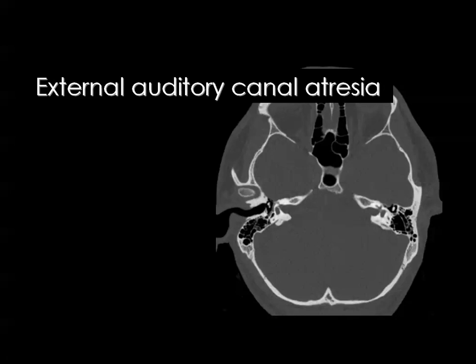It's important to assess the integrity of the middle ear as well as the inner ear structures in cases of external canal atresia, whether the soft tissue atresia or the bony atresia. In this example, the right canal is good, and the ossicles are also of normal size and configuration, while on the left side you can see bony atresia of the external canal, and the middle ear cavity is relatively smaller compared to the right one, and the ice cream cone is no more an ice cream cone, but you can see deformed and almost fused ossicles on the left side.